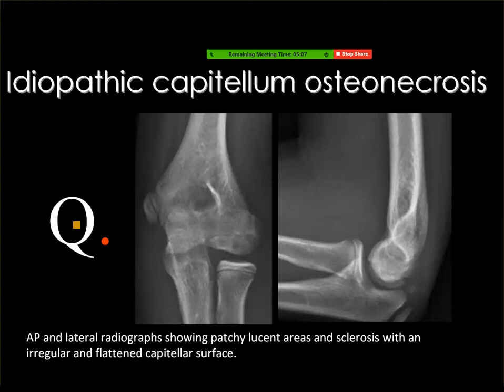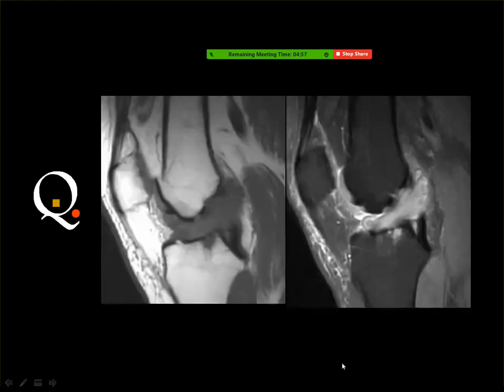No, I don't know this variant actually. I know that this Little League affects the medial apophysis of the humerus. Okay, and let us move to this case, which is also a spot diagnosis case.